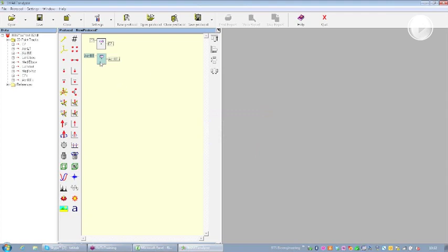So I can still do it for the side that I need. So lateral elbow, medial elbow. That message is always because I already used that name, so every time I paste it, you can see that the name is always the same as the first one that I copied in the first place.